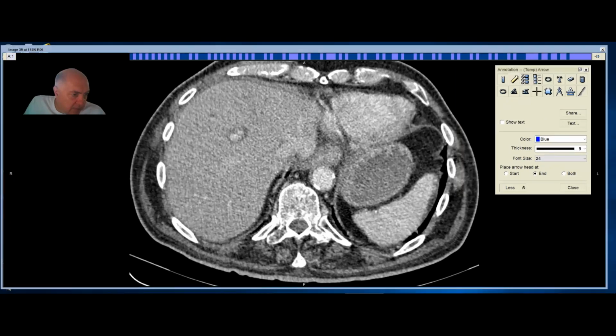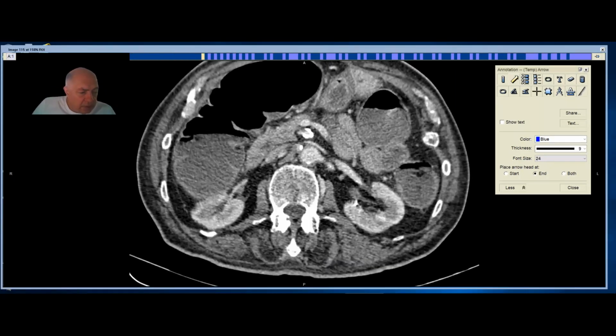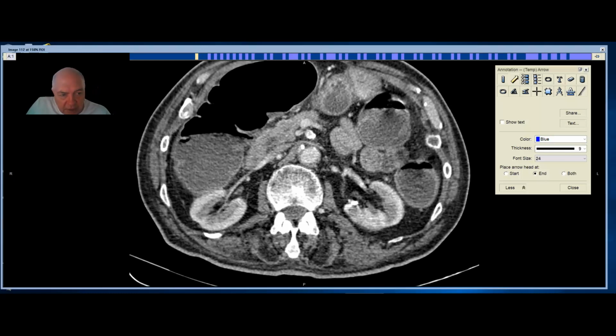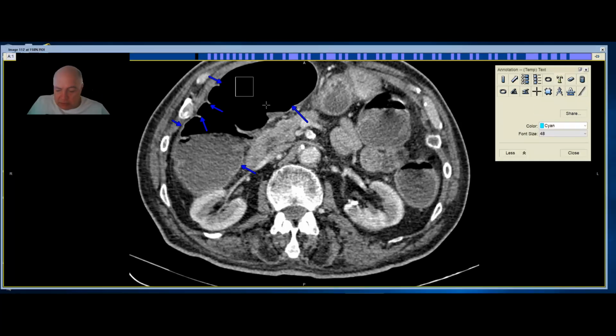That's the CT there. I think what we can note here on the CT again is the colon is very dilated. There's a colon there. These are haustrations there. So this is cecal distension.